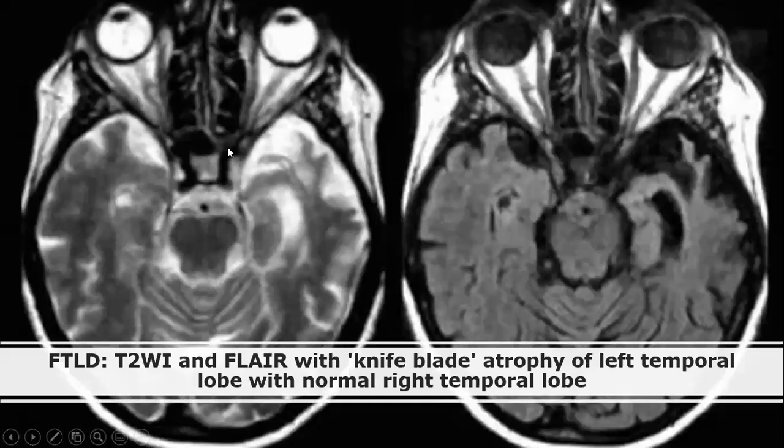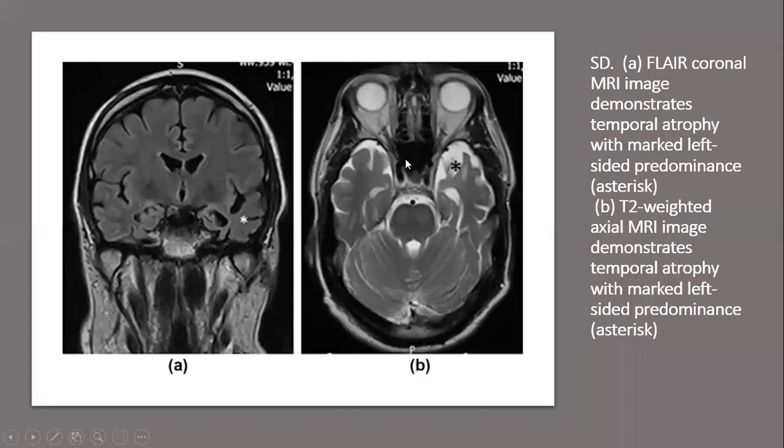Here we have frontotemporal lobe dementia, T2 weighted and FLAIR with knife blade atrophy of the left temporal lobe with normal right temporal lobe. Here we have semantic dementia. As we see, there is asymmetric frontotemporal lobe atrophy. We see here in T2 and FLAIR, there is marked left-sided predominant temporal lobe atrophy.